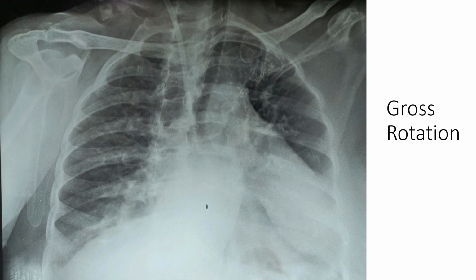So again here also, if you see similar x-rays, just call the radiographer. Make sure that you are taking a reasonably well-centered x-ray, and only then is interpretation possible. Otherwise, if you interpret, you may end up wrong. So that is the importance of rotation, and it is one of the technical quality assessment markers.